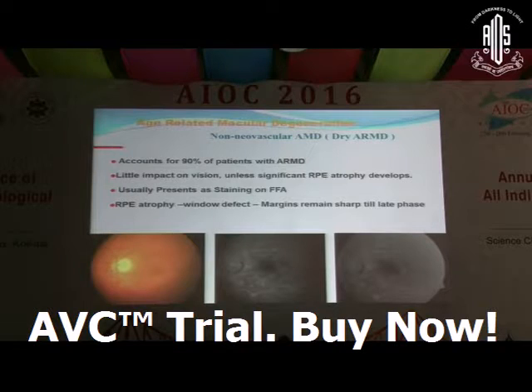drusenoid RPED. Dry AMD accounts for 90% of the patients of age-related macular degeneration. It has little impact on vision unless significant RPE atrophy develops. If you see these yellow things here, what you see is drusen. I think everybody knows how to diagnose it. The typical fluorescein angiographic feature of drusen is that you will see staining.